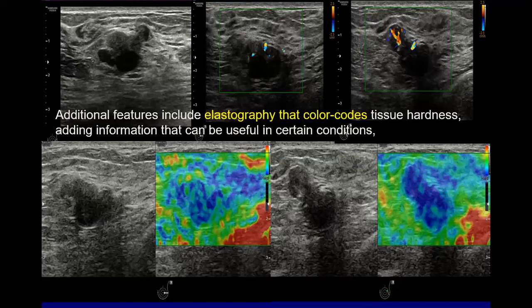We reported it as BIRADS 4A because it demonstrated minimal increase in size and more or less stable characteristics over time, so we reported it as BIRADS 4A and biopsy. And one of the differential diagnoses we mentioned was that the patient could be having fibrocystic changes. We put fibroadenomatoid changes as one of the differentials, and it was proven pathologically.